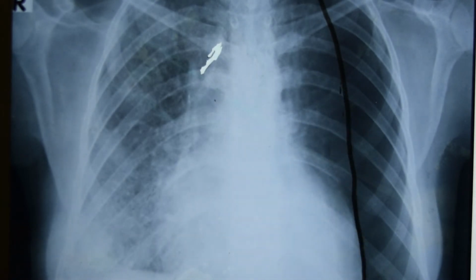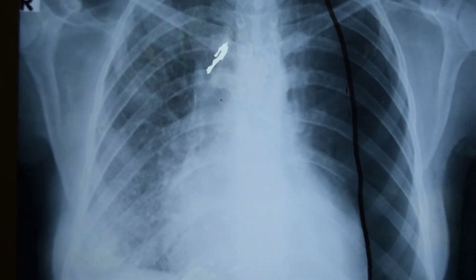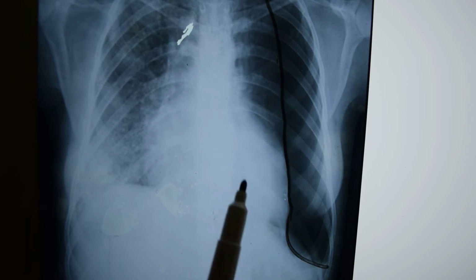This area is jet black. There are no lung markings here. And this is also giving a very important sign. Whenever the costophrenic angle is deepened towards the diaphragm, if we compare this costophrenic angle with this one, here is some pleural effusion. This is the thin visceral line which is going to separate the parenchyma of the lung from this jet black area. This area is extending downwards deeper in the diaphragm.